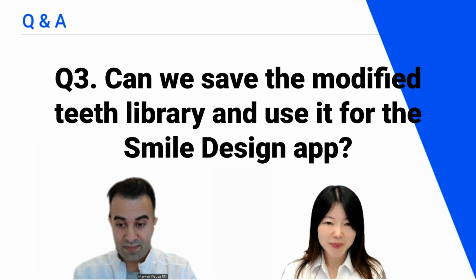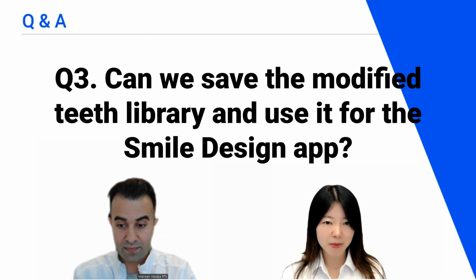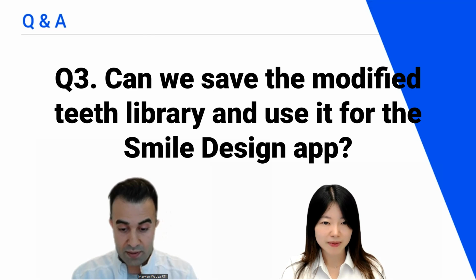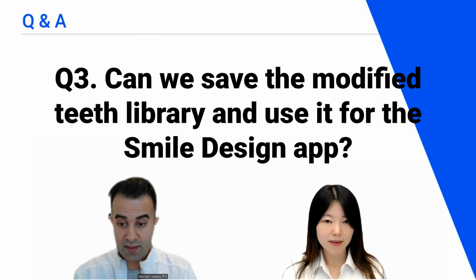Okay, last one. Question number 3. Can we save the modified teeth library and use it for the Smile Design app? Yes. So once we obtain the 3D teeth library, you can see it's time consuming. However, we're going to do it only once. And then we can export it to the Medit Link and we keep it there.